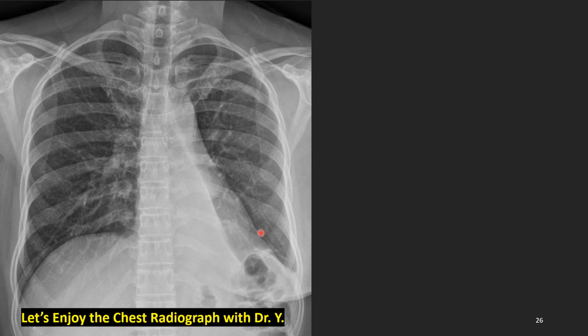Then you are the last one, left lower lobe atelectasis. Sure, right. Very characteristic, triangular shape, increased homogeneously, increased opacity here. Aorta line is obscured. Paraspinal line is obscured. That means this is posterior location. This is normal heart border. We see something more here. Round. Yes. Proximal mass.